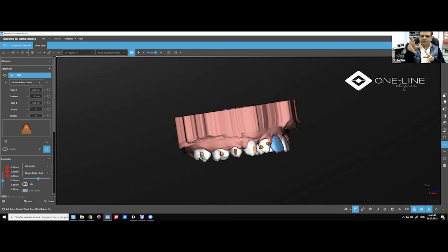I saw on a forum, I will not name the forum, but somebody had planned this kind of attachment, but they were put like this. In the center of the teeth, they were put correctly, but the position was not correct. If you make it so, nothing will happen. You need to plan the movement. You have to understand where you want to have the force vector. If the force vector is not correct, there's no movement. This was a mistake done by somebody.